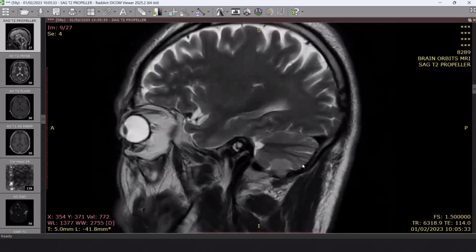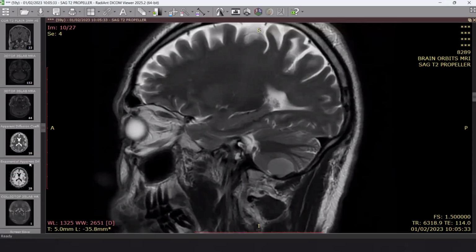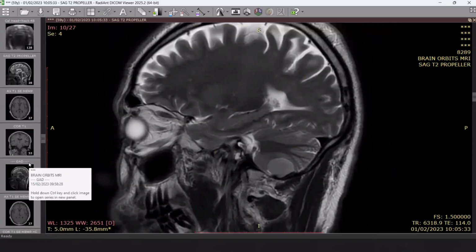Okay, so extra-axial lesion, what's your differential diagnosis? So first is meningioma. Very nice. The second can be dural mets. I think those are the top two differential diagnoses. What's your next step? Sir, as there is no multiplicity of the lesion noted, the first differential would be meningioma. But sir, I guess I would refer the patient to the neurosurgical department for further management.